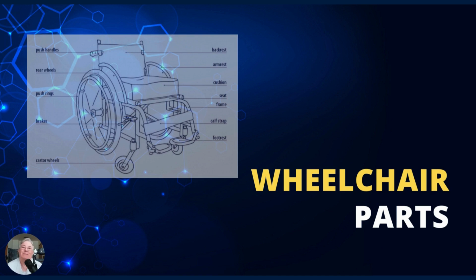But if you're wanting to know the different parts of your wheelchair, I did the simplest one. So there are some parts that are really obvious, but sometimes they're not. So you want to be able to go back to this presentation if something breaks, or you just can't think of the word. You can go back to this presentation and say, oh yeah, that's what it was called.